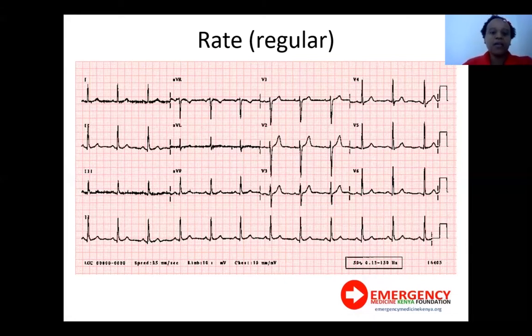As you can see, the full strip is on lead 2, so you can easily count and see whether your rhythm is regular or not.